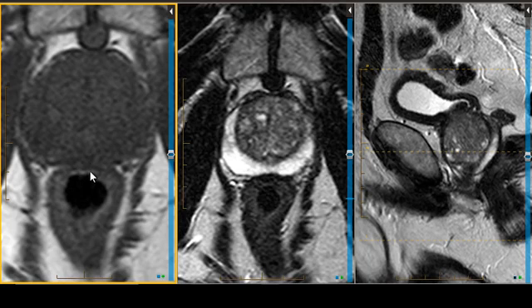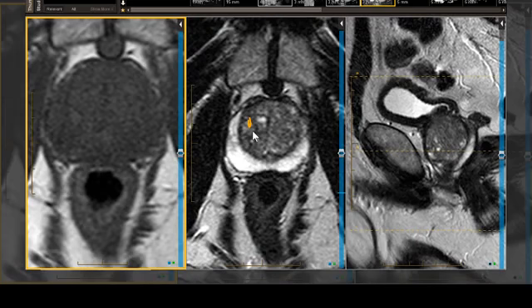But that concludes our discussion of zonal anatomy. Talked a little bit about the capsule. The surgical capsule is defined as the junction between the central gland and peripheral gland. We're going to look for transgression of that when we have central zone lesions that cross it. For if you have a charcoal lesion that crosses that surgical capsule, you got problems, and then you start going into your zonal naming anatomy, which we just covered.